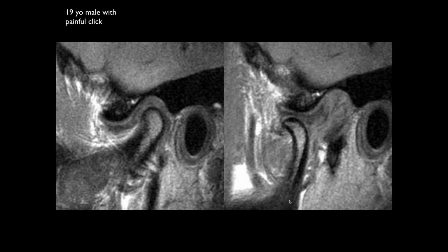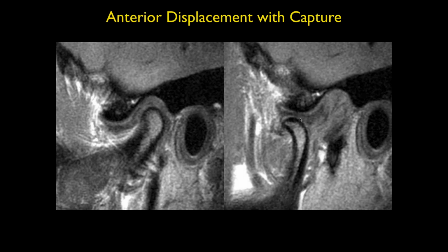Okay, here is the open mouth position. Yeah, so the condyle captures on the open mouth view. And here there's probably tearing of those retrodiscal structures back in through here, but we see that it captures. And the painful click was when he captured the disc.